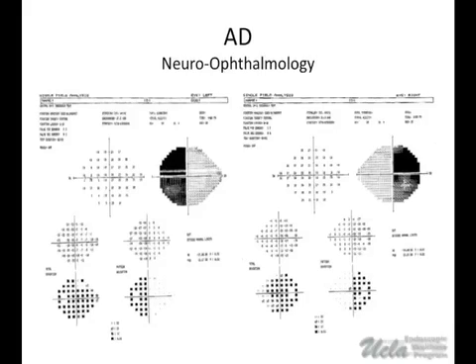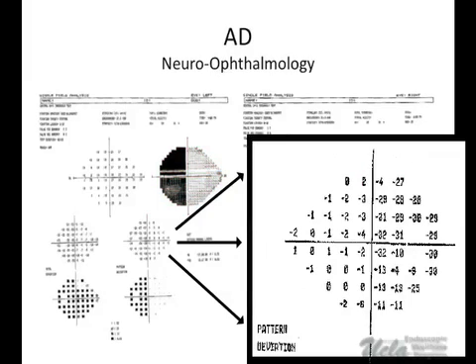This is a pretty detailed test. I always tell people who don't look at these very often that they're not testing all these little dots in here. These are the points that are tested, and then this is a computer interpolation, which sometimes is misleading. So we actually look more at these numbers, believe it or not, than the nice pictures that represent it. So this is the best one.